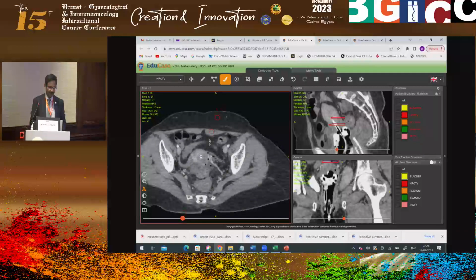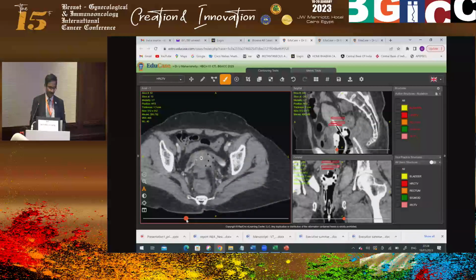So as you come down, this entire cervix you can see here. In this region I am not going to contour parametrium because uterine artery is seen here, right? So as I go down, now it is very clear to me. This is cervix. That's the parametrial tissue. Maybe go more here. More here. If I want to measure, again I will go back and do the measurement. 24. Fits very well, right?